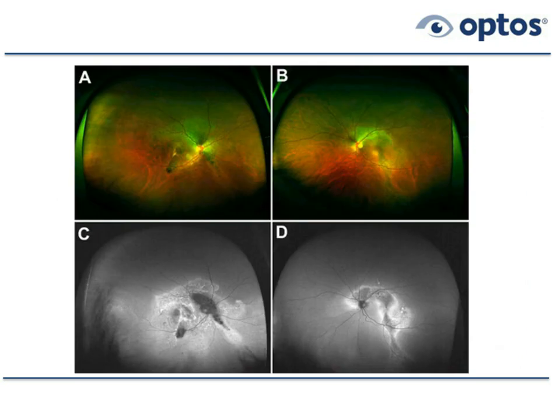We can see the color images above, and below that we can see the autofluorescent images. Notice that there are some zones that are dark, which means the retinal pigment epithelium has died, but we also see bright zones, which are metabolically active or sick RPE cells. So the lesions below, the autofluorescence of the right and left eye, are showing activity. Not the dark, but the light zones are showing activity. The hyperautofluorescent zones are showing activity.